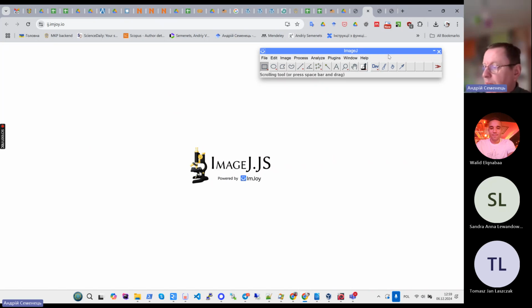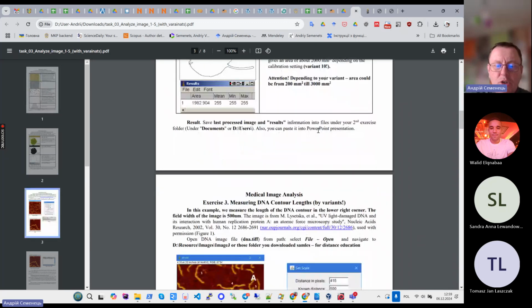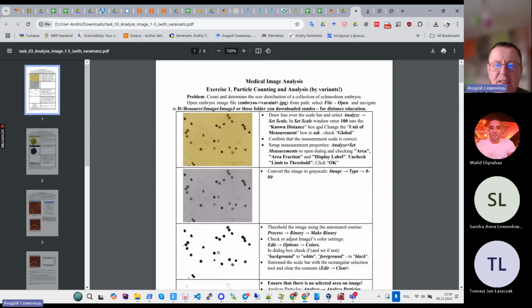So your primary goal will be not only to modify the image, but rather to make some calculations and retrieve a numerical assessment from the image. That's one of the main features this application provides. And now, practically, when we start, we should check and fix the application's basic settings.